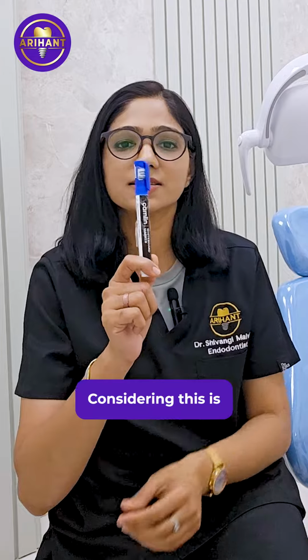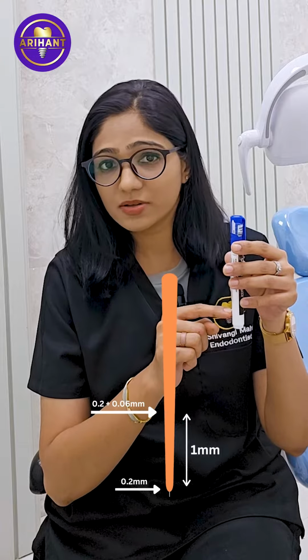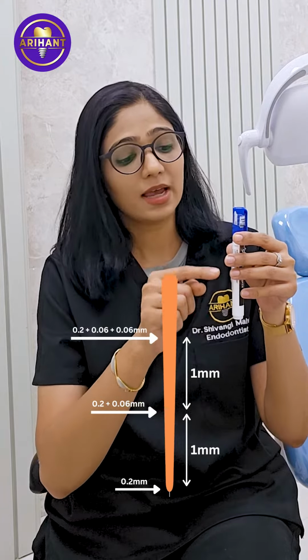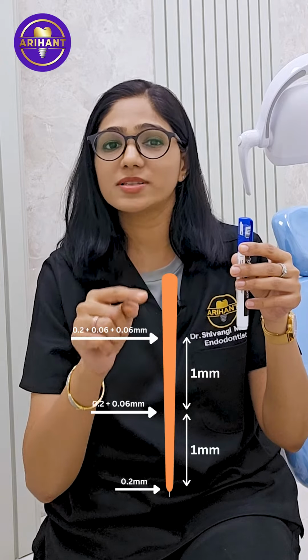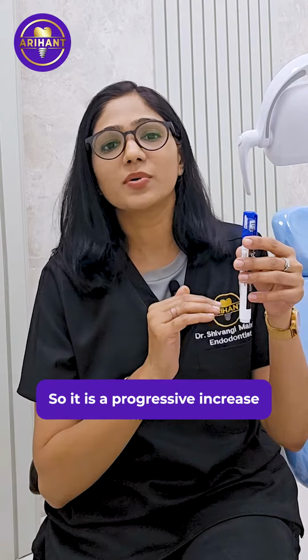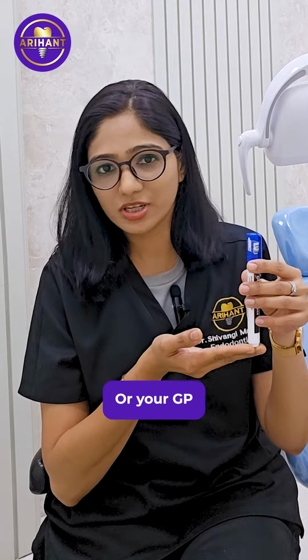Now considering this is a 6% GP, the tip diameter is 0.2 millimeters, then at 1 millimeter it is 0.2 plus 0.06, at another millimeter 0.2 plus 0.06 plus 0.06, at another millimeter 0.2 plus 0.06 plus 0.06 plus 0.06, so on and so forth. So it is a progressive increase in diameter from the tip of the instrument or your GP. That is taper. It can be constant taper or variable taper.